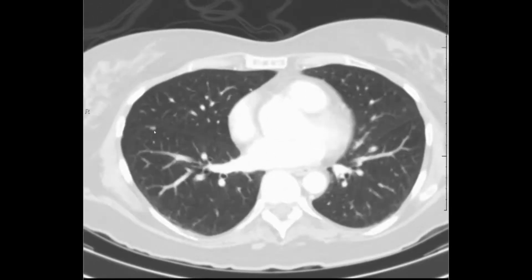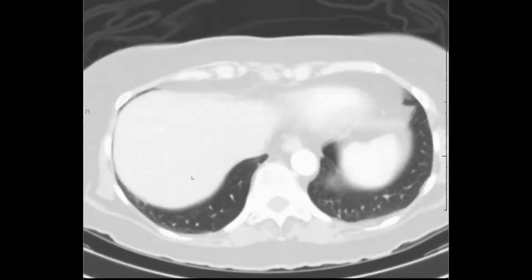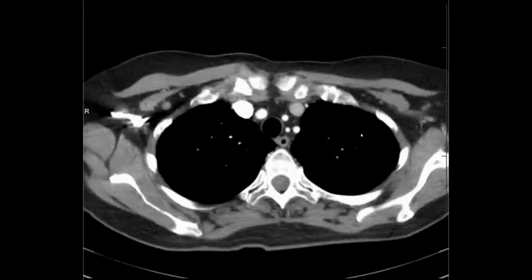And then you see these guys, this is kind of a triangular shaped subpleural nodule that's associated with the major fissure. And in this case, anytime you see a lymph node or a nodule that is associated with the major fissure or minor fissure that is triangular in shape or kind of quadrilateral, then you can think it's a fissural lymph node. I don't see anything here. Quick view. Of course, I would do this a lot slower if I was to evaluate this.